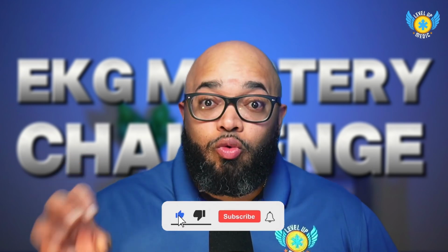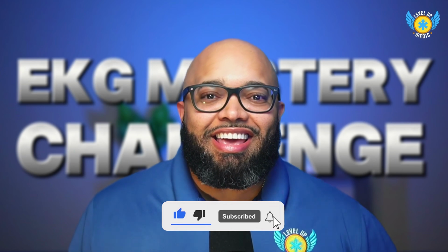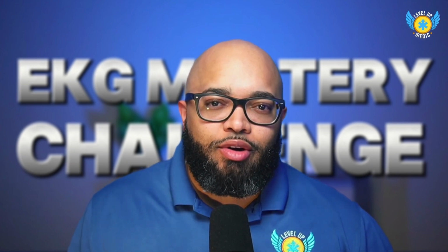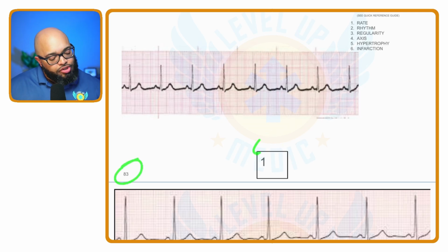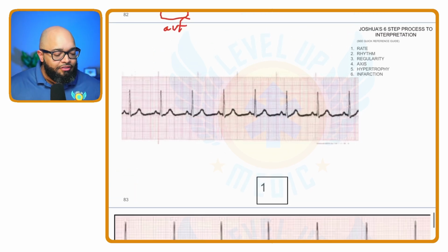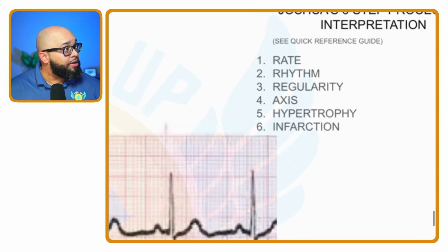So we're going to go right into interpreting the EKG. I'm going to go ahead and pop that up on the screen for you, and let's just get started. We're on page 83 of your workbook. We're going to start off with EKG number 1. Now, the very first thing, let's just zoom in for you here.